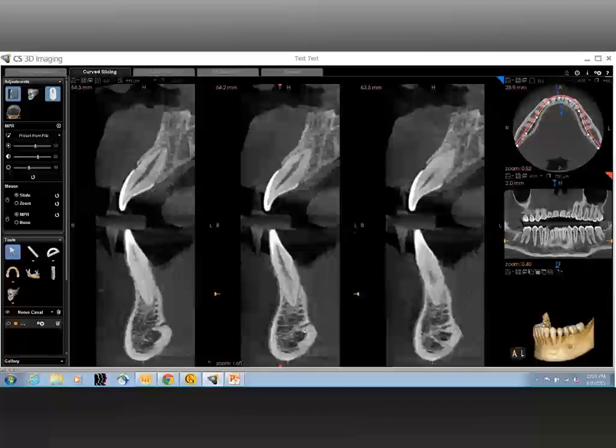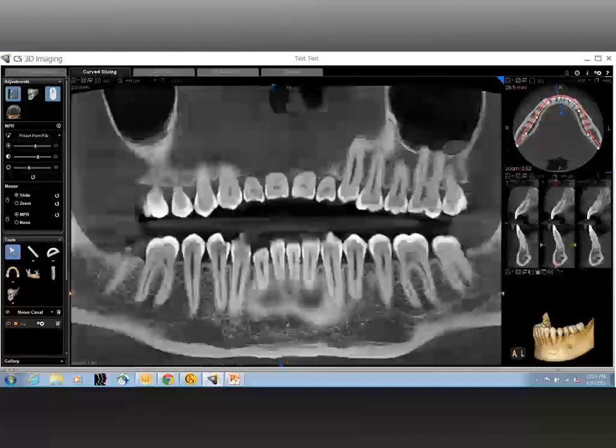Excellent. Well, I see in the software that you're denoting the L for lingual, and we're seeing that right there in the midline. If you don't mind, could you zoom in on the curvilinear view so we can see? There we go. Thanks. We're right there in the midline of the patient. So the inferior alveolar nerve, the mental foramen, and the lingual foramen. What are the important features of the mandible to be evaluated while planning for implant surgery?